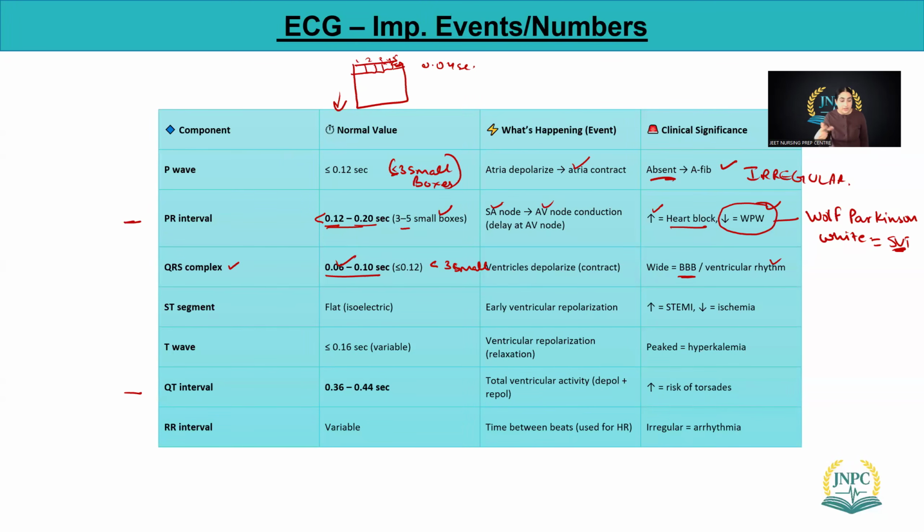Think about your VTach, ventricular tachycardia. Those can happen when there is some issue with the QRS. When you see the QRS complex is wide, you can only see the QRS, there is no P wave, and they are very wide. It could be bundle branch block, or the ventricles are in tachycardia, or maybe they are fibrillating. So they're taking too much time. They're not resting at all.